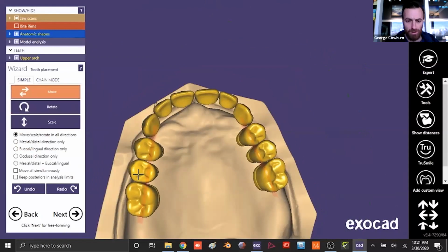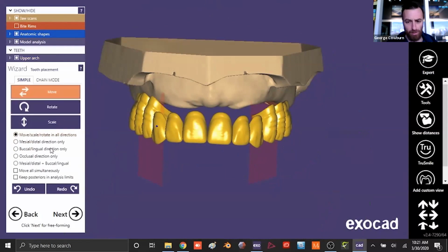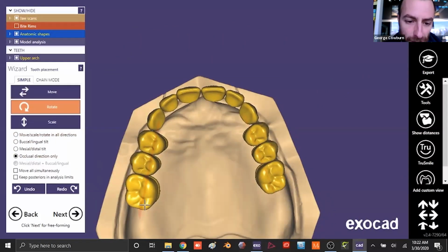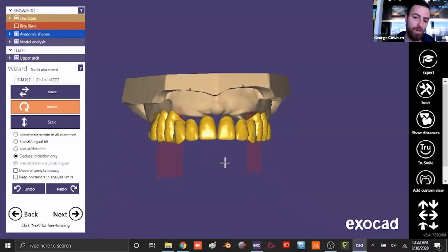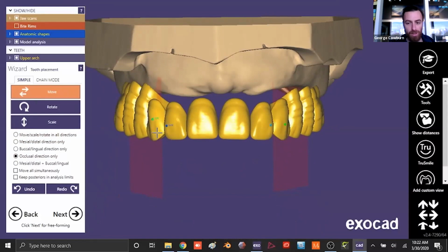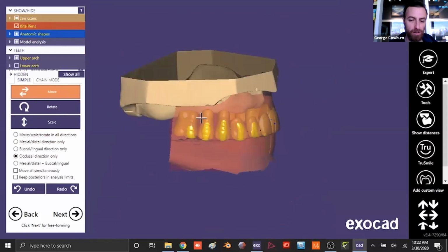And now it was a little bit extreme on our lingual inclinations of those teeth, so we want to move them down a little bit. We'll have the opportunity to adjust it if this creates any interferences. Sometimes the buccal cusps of the teeth will create interferences if they're hanging down too much. In this case, it was a lingualized setup, so we wanted to lift up those buccal cusps a little bit.